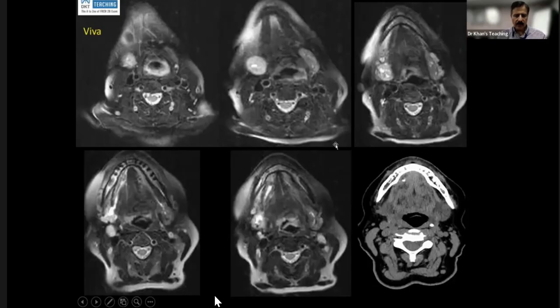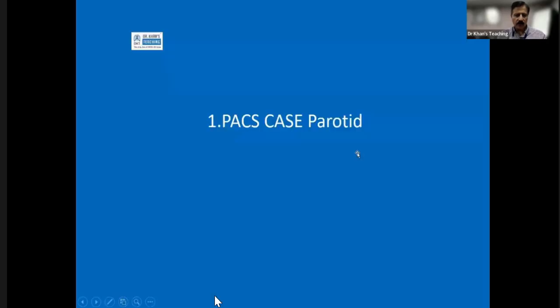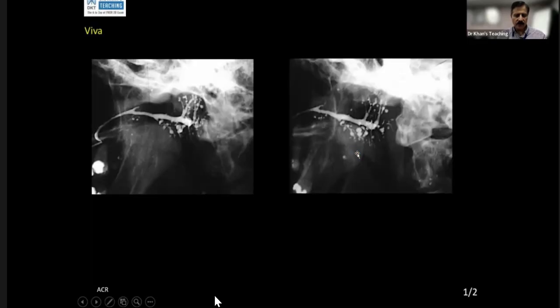So another case of sialadenitis, secondary to a stone. Okay, can you tackle this, please?